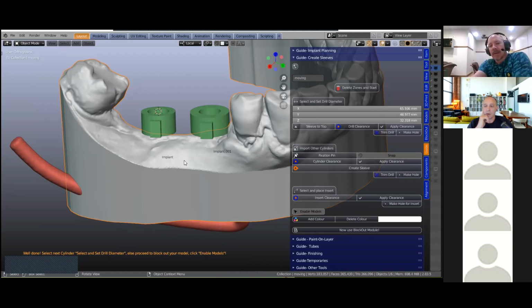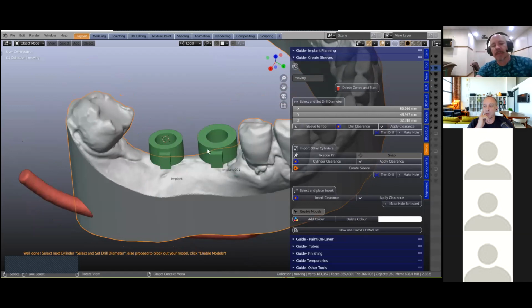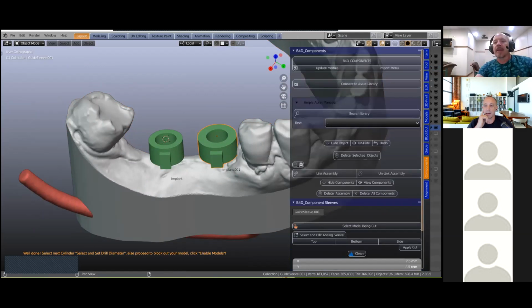Yeah, we try not to have a surface to surface fit at all. It's like a nut and a bolt system. Engineers call it engineering fit. We will always have an offset as a starting point. So you can set, if you want to set it to 0, which we don't recommend, just put a small value in there. If you want metal inserts, we've got metal inserts in the component library.